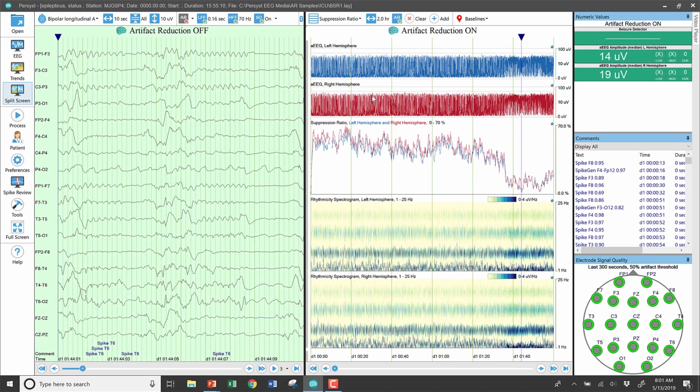Changing low amplitude patterns can be seen well due to their linear scale at the low end of the graph, while the log scale in the upper half of the graph allows good representation of high amplitude activity, such as seen in many seizures. A distinguishing characteristic of this recording is the AEEG looks essentially like a wide band. This type of AEEG pattern is characteristic of burst suppression. So when seeing the combination of this type of AEEG pattern, along with a relatively high suppression ratio, you would expect to see the burst suppression pattern that we see in this EEG.